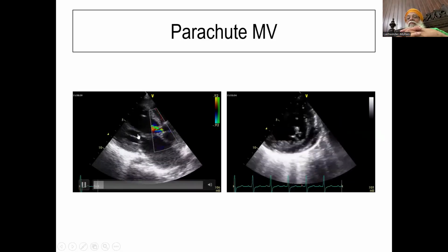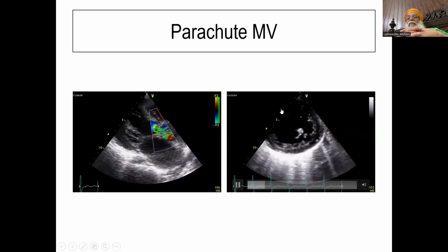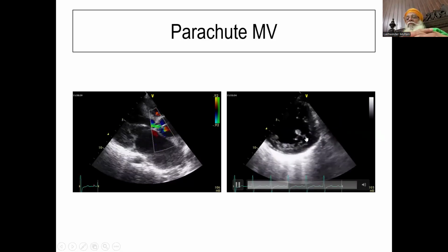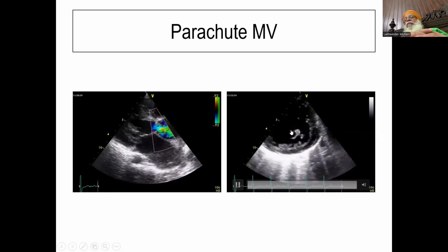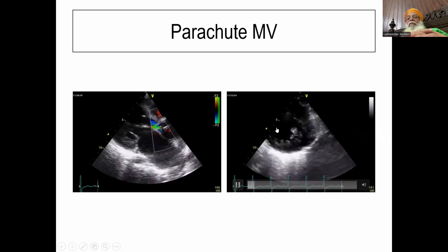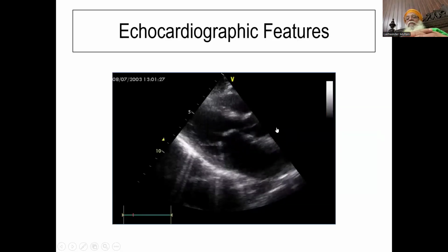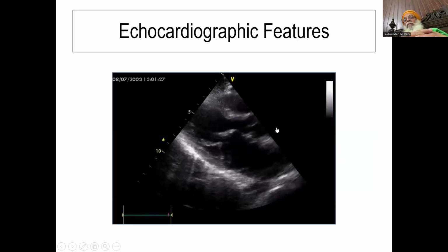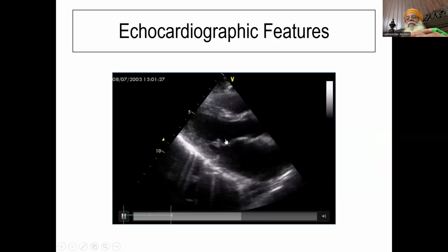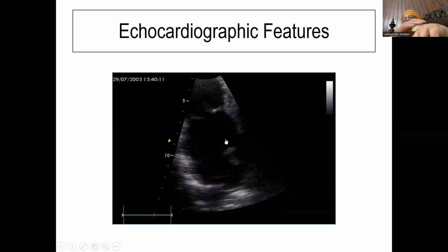So you look at this stenotic kind of lesion out here, and on top of that, if you go to the short axis view, you will find only one papillary muscle as seen over here. The lateral papillary muscle is seen, the medial is lost completely. And this is a congenital heart disease presenting like a parachute mitral valve. Again, an example, look at the hockey-shaped structure of the mitral valve leaflet for this particular phenomenon.